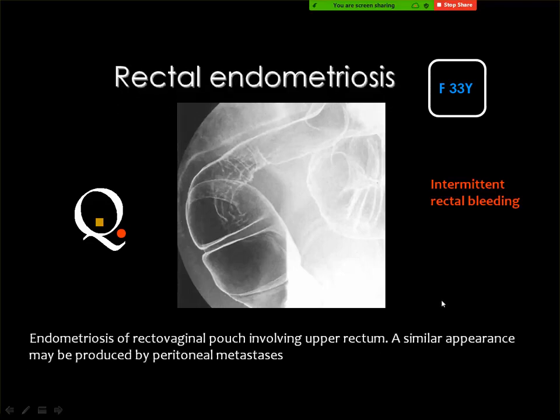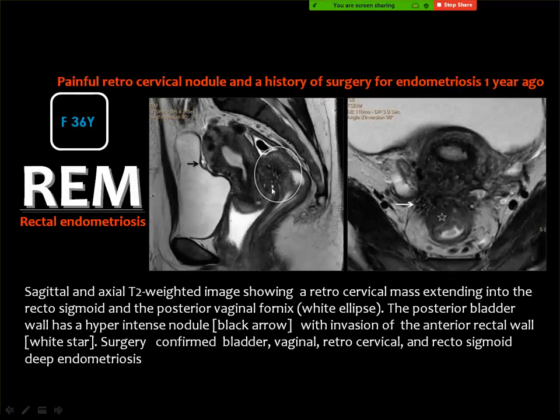Endometriosis. This is a very classic appearance for endometriosis in the rectum. And you got irregularity, which is seen also in the MRI as mushroom shape. And this is an example. Here you see this is the endometriosis. It usually affects the anterior aspect of the rectum, while in the bladder it affects the posterior aspect of the bladder. And you got these very characteristic bright signals within the lesion, and also the classic history of periodic bleeding.